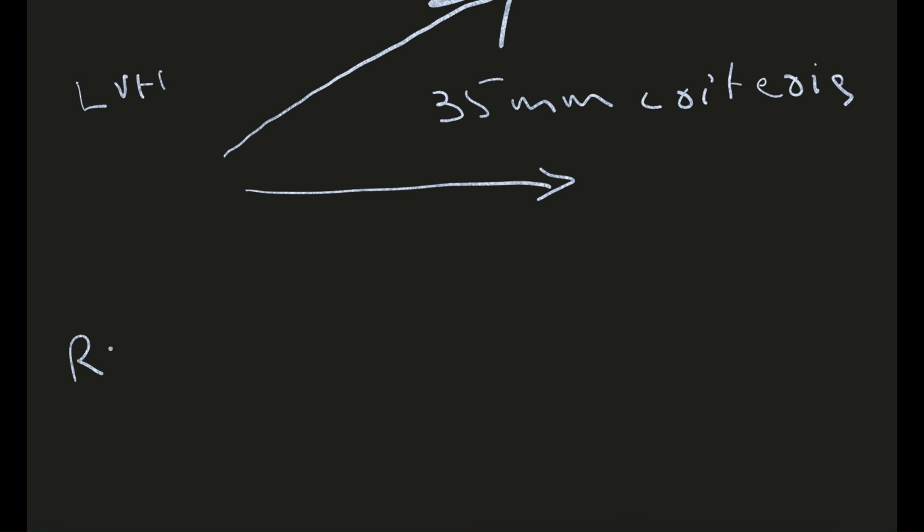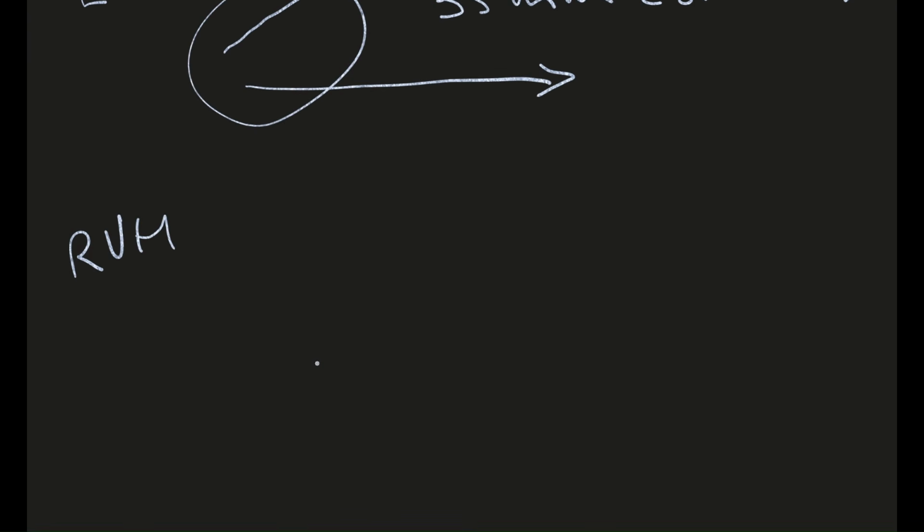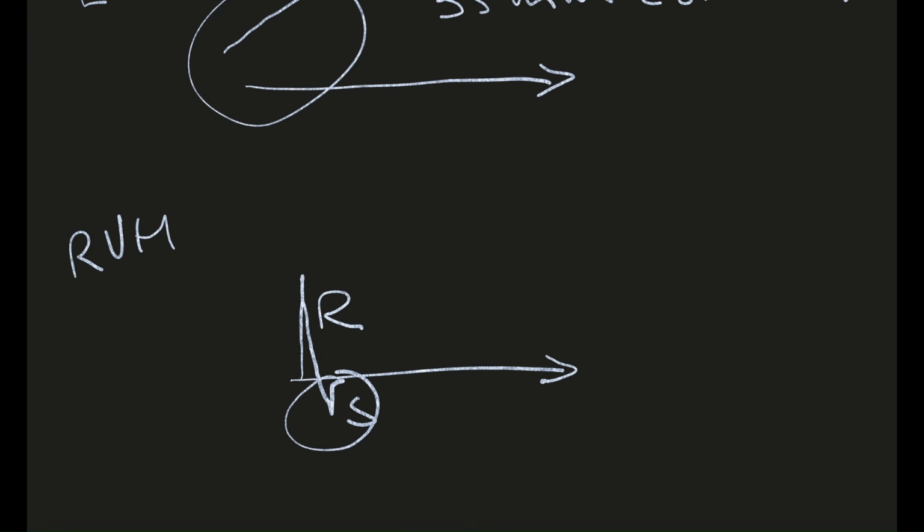And in right ventricular hypertrophy, look at this chart. In RVH, for example, this is the isoelectric line. The QRS complex, the R wave will already be so much positive. The R wave will already be way bigger than the S wave. If you trace the pattern of this QRS complex, it will be more like this.